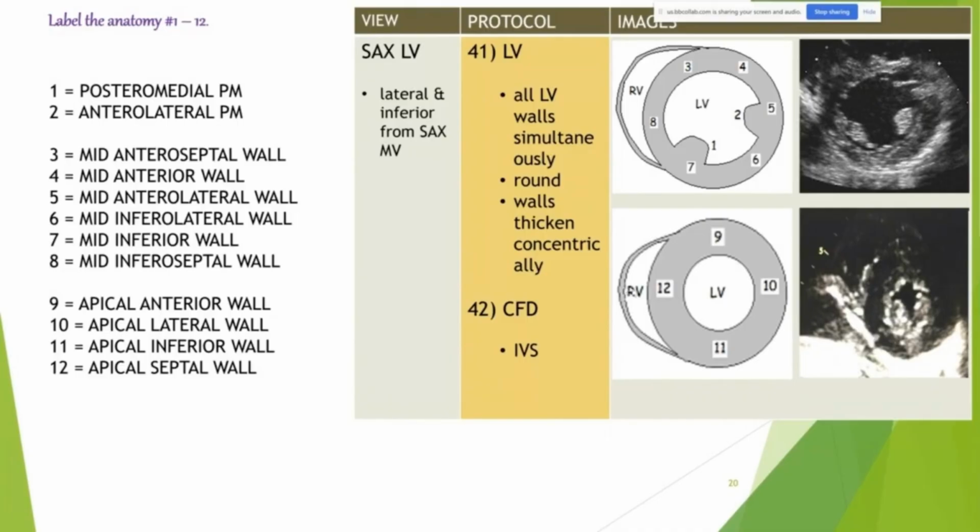Are we good now? Because this is the apex, I don't like this picture because I don't agree it's the apex, because you can still see the papillary muscles. This is the picture from your book. I don't like it. Sorry. This is mid. When you see papillary muscles, you're about to head into the mitral valve territory. This is not a true apex. I don't like it at all. But it's what's in your book. I disagree with it 100%.